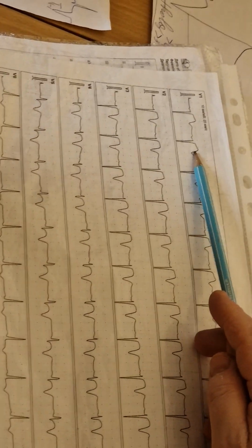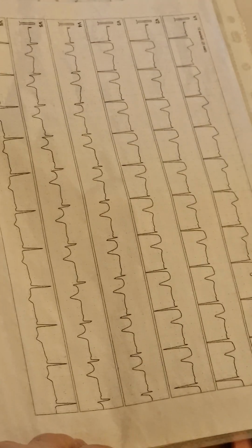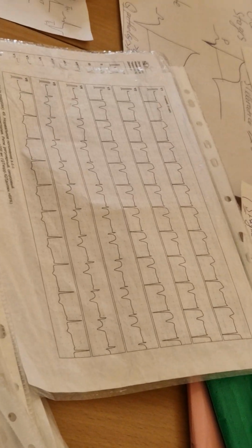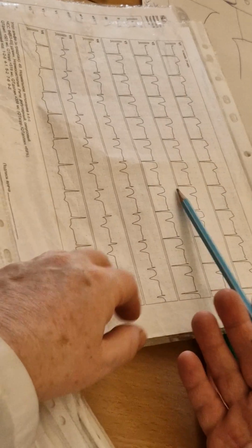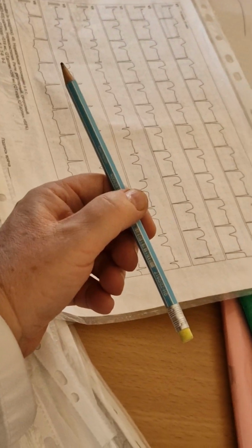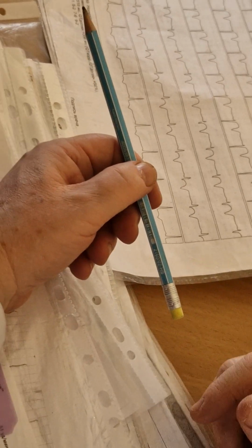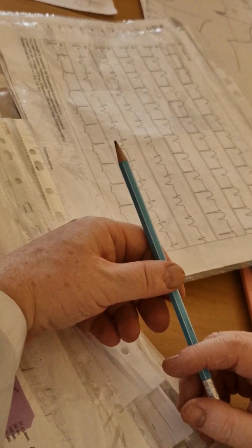So it's maybe a non-Q wave infarction, if such changes are not reversible within 24 hours, or severe acute coronary syndrome with unstable angina. If we see elevation, such a patient has an indication for troponin test and coronarography, not more than 12-14 hours after the start of severe pain.